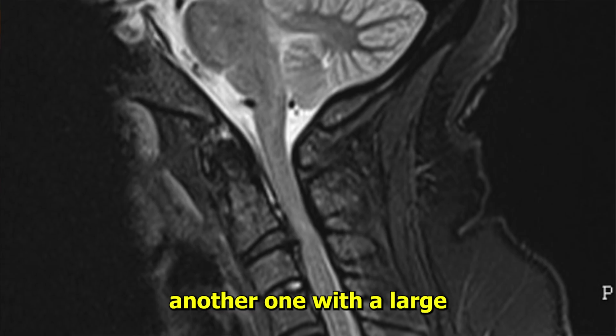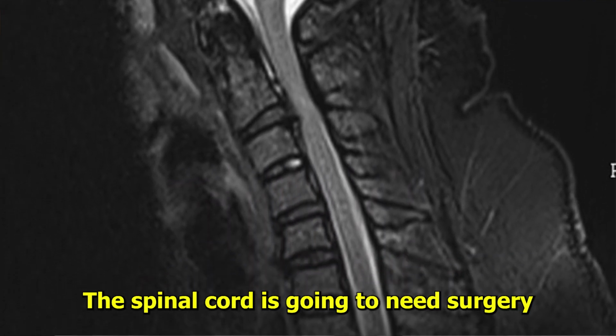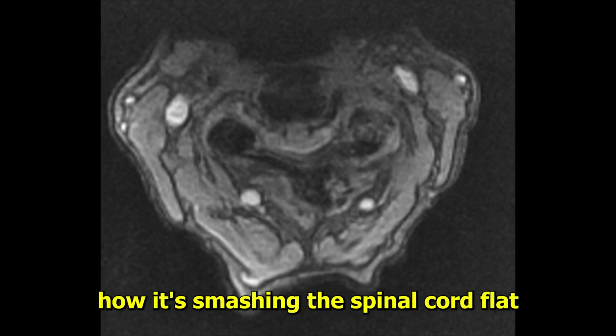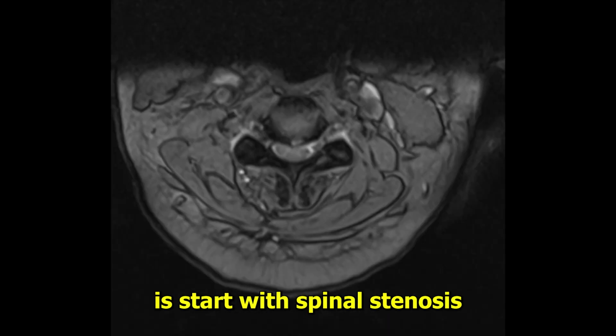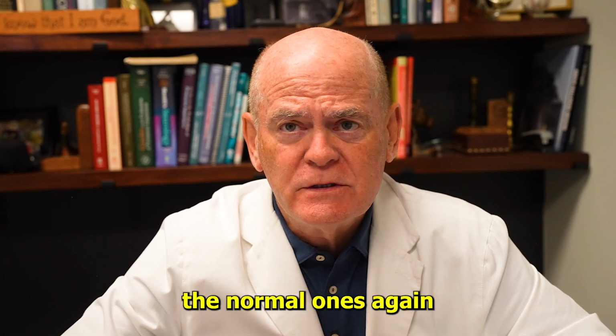Another one with a large spur at C3-4, it's bruised the spinal cord, it's going to need surgery. And you see the axial view, how it's smashing the spinal cord flat. Here's another one, a large spur at C3-4, spinal cord contusion. The central version, the axial view, is with spinal stenosis. So that's amazing when you look at it, and let's look at a few of the normal ones again.